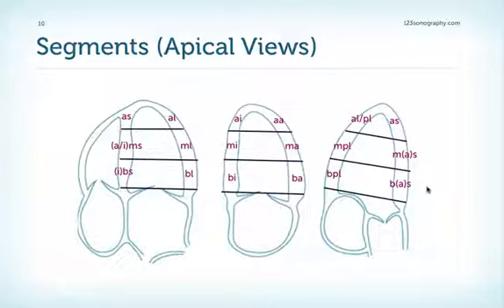I know this all seems pretty complicated, but you can find this diagram also in your fact sheet. And when I show you examples throughout this course, I will repeatedly name the different segments, so you will see eventually it's not that difficult.